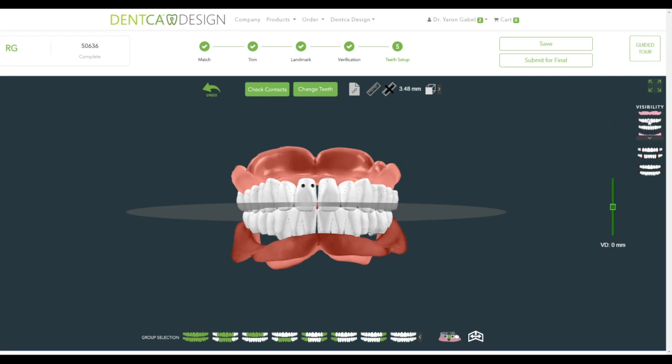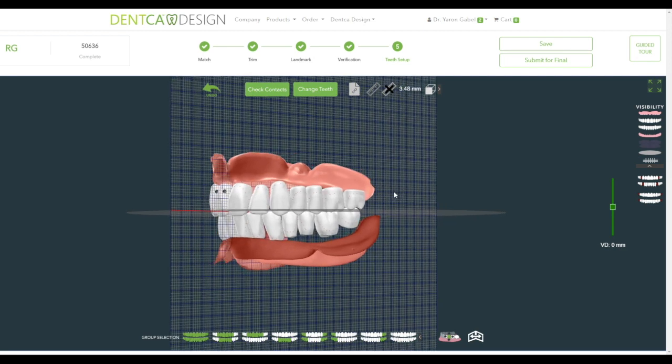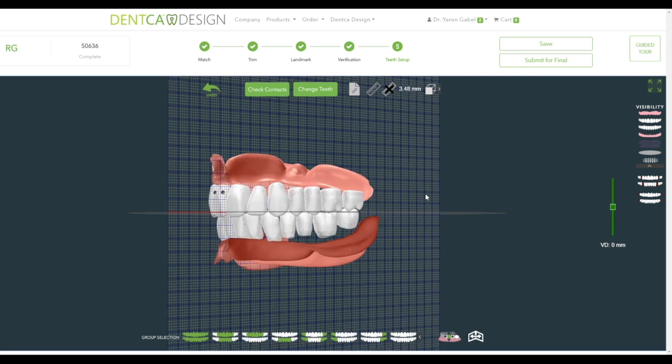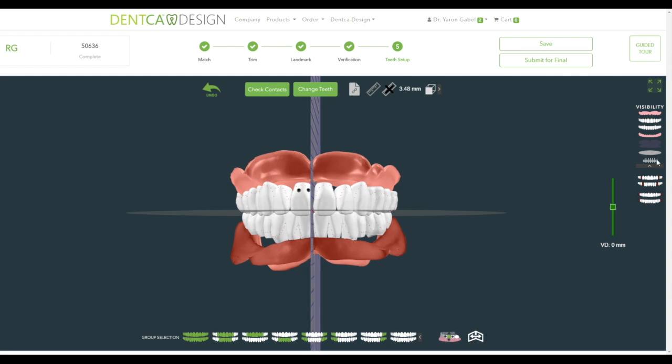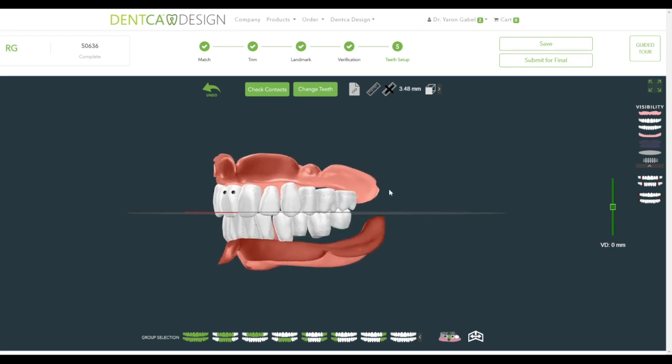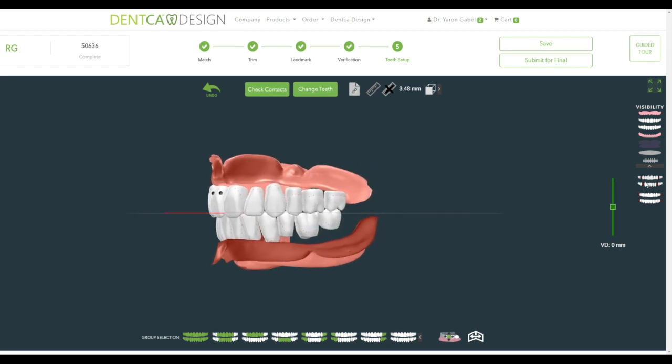For your convenience, we have also created a 1mm grid function that can be activated on the right visibility menu and can be toggled to appear horizontally or vertically as needed. If space is limited, you may click on Function on the lower right side to remove the first premolars or second molars from the setup.